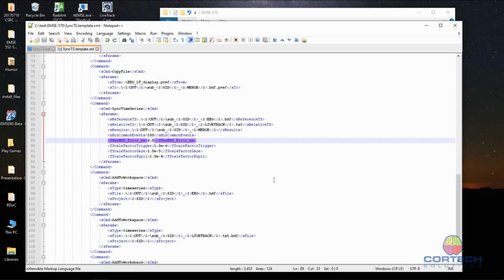If the clocks are oscillating at a very slightly different frequency, or more likely if the reported clock rate that the software gives us isn't out to the same number of decimal points for each case, and we use those reported rates, then after a very long recording, it could go out of sync even if we've properly aligned them with the offset.